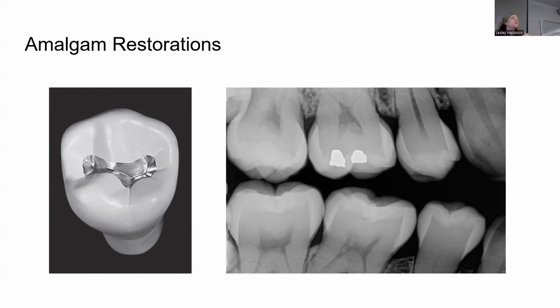But they don't do that anymore. But if it's an old material from a patient, maybe in their 80s or 90s, they might have retained some kind of old material. So you just have to be aware of the way things show up.